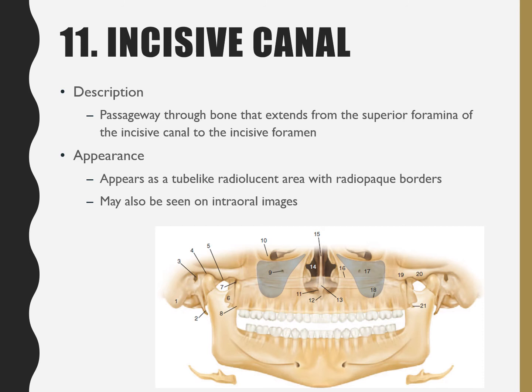This incisive canal can also be called the nasopalatine canal. A lot of the times the word incisive can be swapped out for the word nasopalatine. I like nasopalatine better myself because it describes where it is, but I'm not really sure where the incisive comes from. But yeah, so this number 11 right here is the incisive canal.